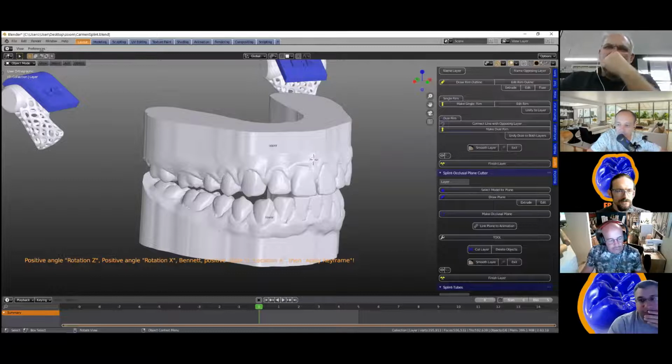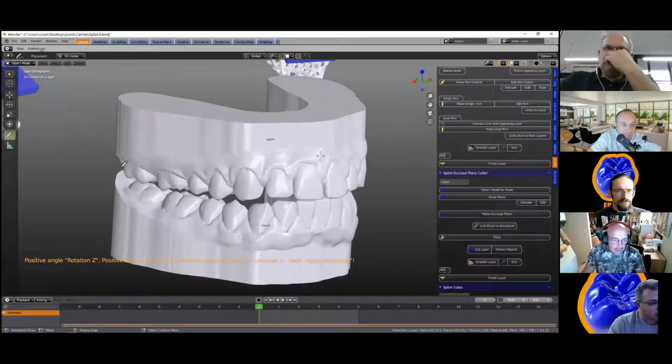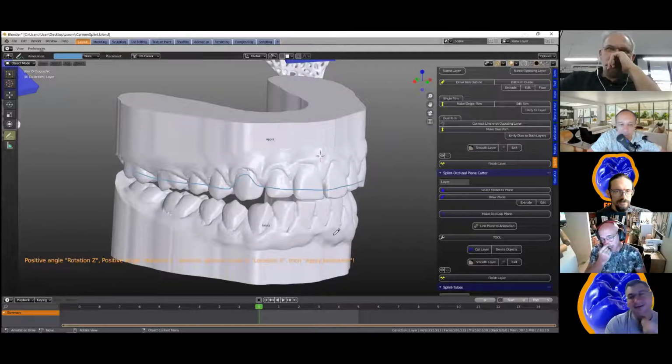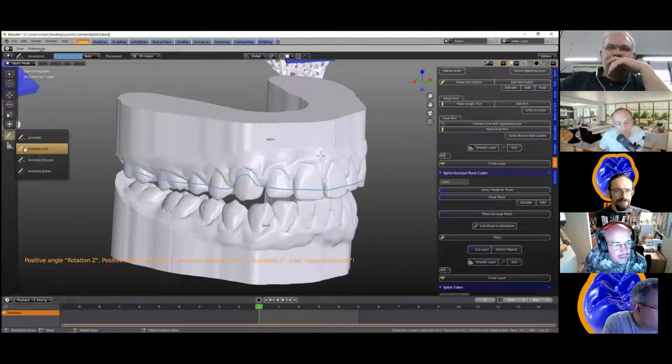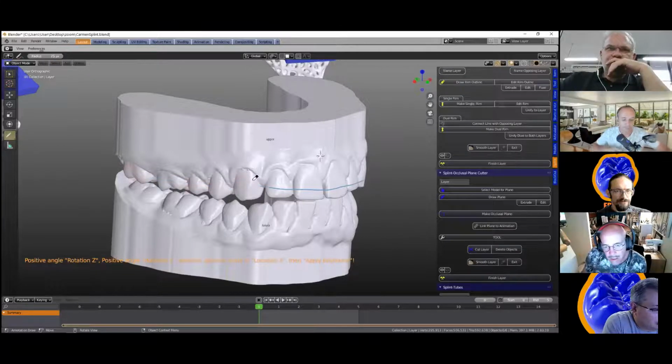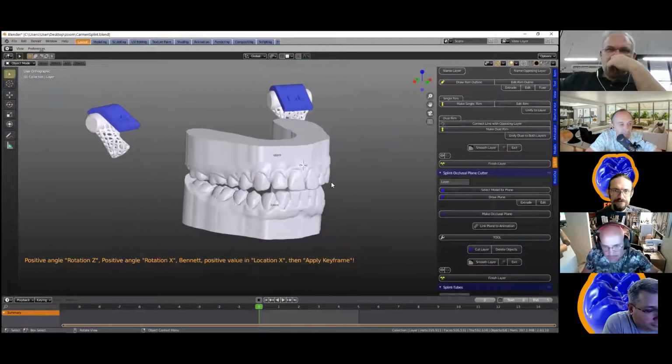And let me just grab a pen here. I see a lot of them on some social media groups. We see this all the time. I see this, and my question is, how is that going to stay in the mouth? I do shake my head. But anyway, that's a different subject altogether. So let me just take this away and show the splint here again.